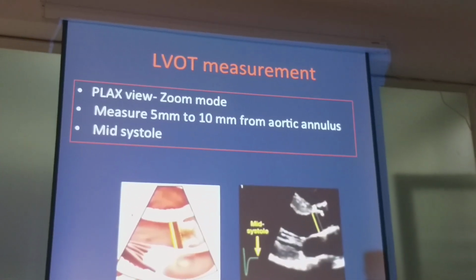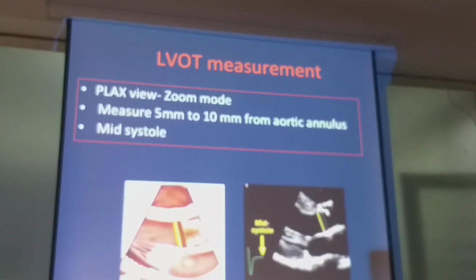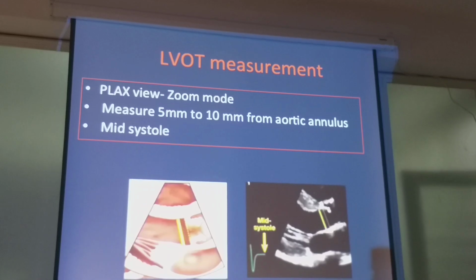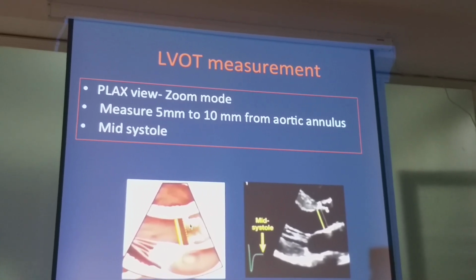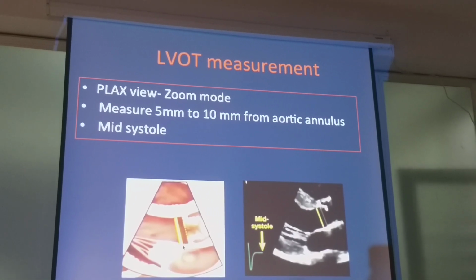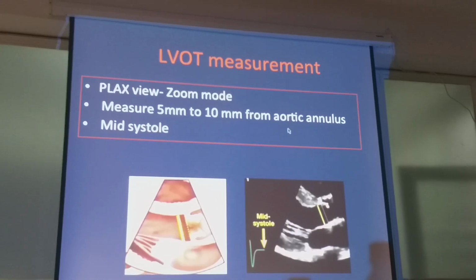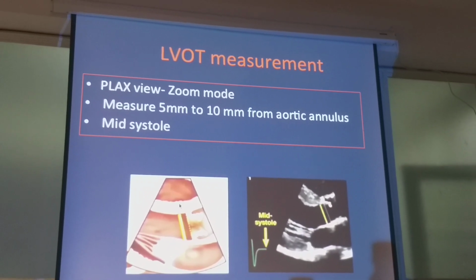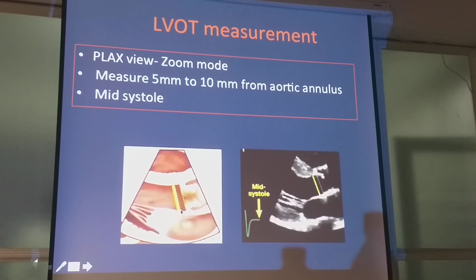এটা কিন্তু লেটেস্ট গাইডলাইন্স এর ছবিটা, রাইট? আগে একটা কনফিউশন ছিল আমাদের অ্যানুলাস আর LVOT ডায়ামিটার কোথায় মাপবো কোনটা। এখন দেখো এখনকার পিকচারে কোনো অসুবিধা নেই। অ্যানুলাস ইজ ফ্রম দ্য হিঞ্জ পয়েন্ট টু দ্য হিঞ্জ পয়েন্ট, আর LVOT is within 1 centimeter, within 10 millimeter, right, from the annulus, and it should be measured in the mid systole. Clear? So this is the LVOT diameter.